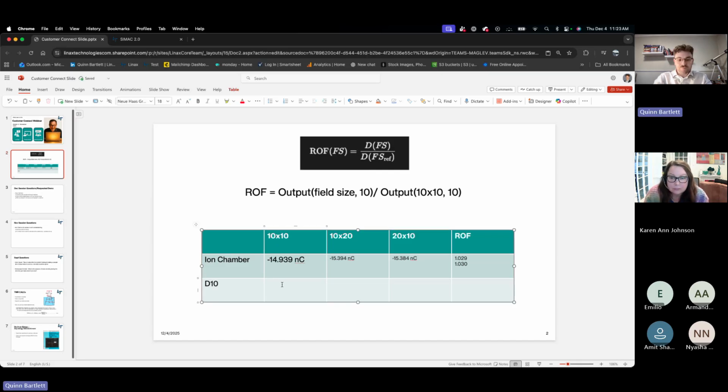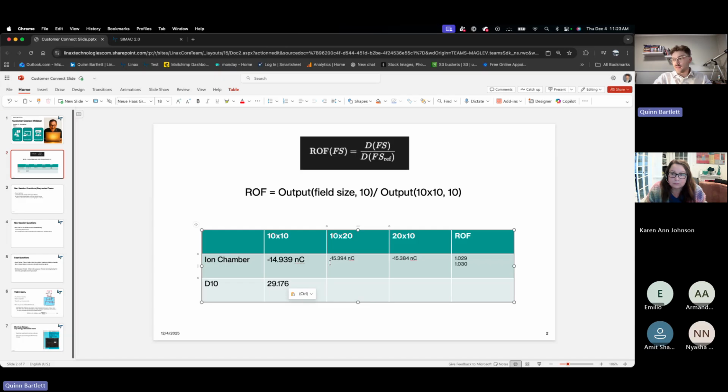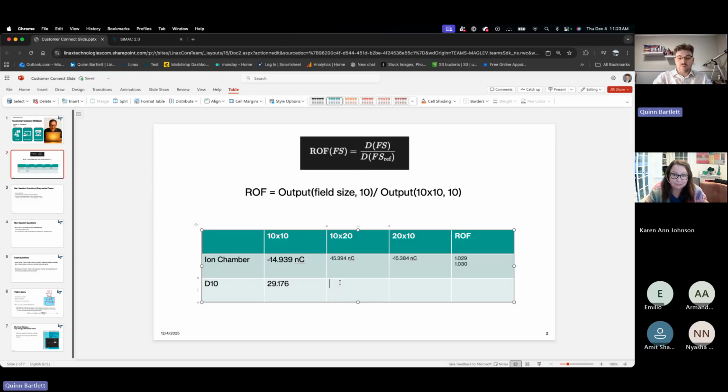What just happened there? You could probably just guess that the ratios are very similar. And then I've done the math. I did it yesterday, and it does actually produce the same ratios there.